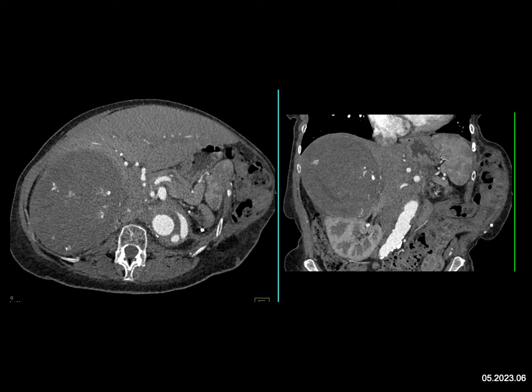Mets to the adrenal are a possibility. It's very large, but it could be a possibility. The Mets typically don't calcify. Most likely, to me, it's adrenal cortical carcinoma. Large mass, cystic and solid calcifications. I don't know what else I could say. It's got to come out. I don't see any spread, but it's a large mass. It's a carcinoma. This was resected.